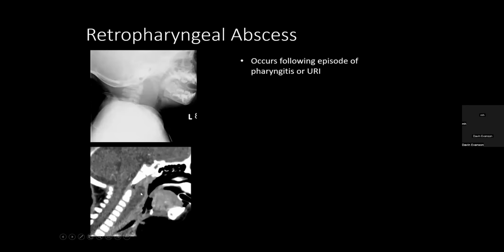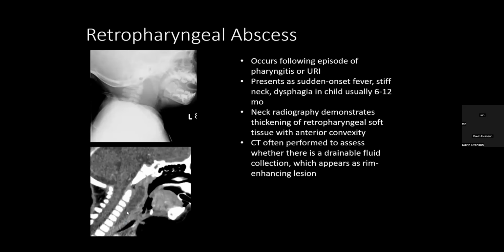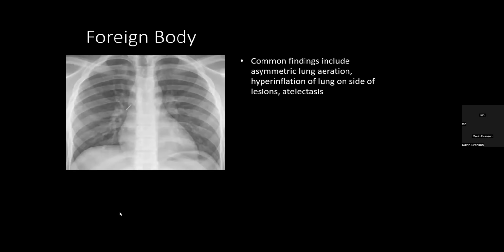Okay, retropharyngeal abscess. And we're looking at the spine. Do the ABCs. There's too much soft tissue there, confirmed on the CT. Again, have to be suspicious about this to order the right test. That's the first thing, and then make the diagnosis and then treat it.